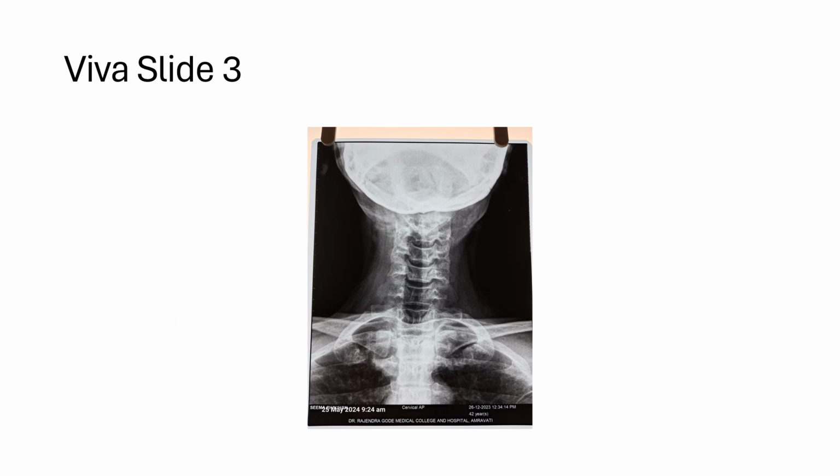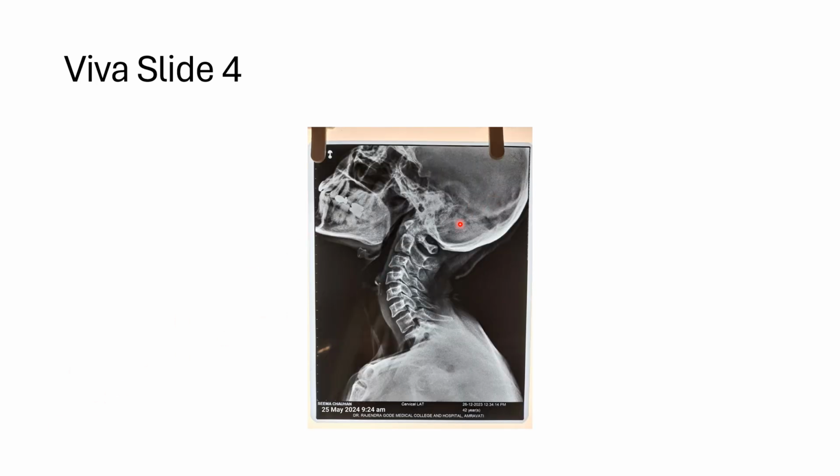collection. Now you see this is the neck. You can see beautifully the anterior aspect of the neck in the lateral view. Here you see this bone, the hyoid bone. You can count the cervical vertebrae. Thank you very much.